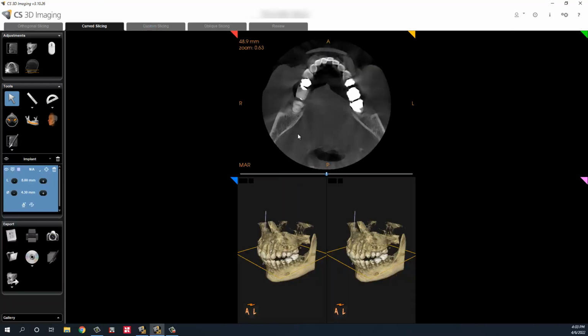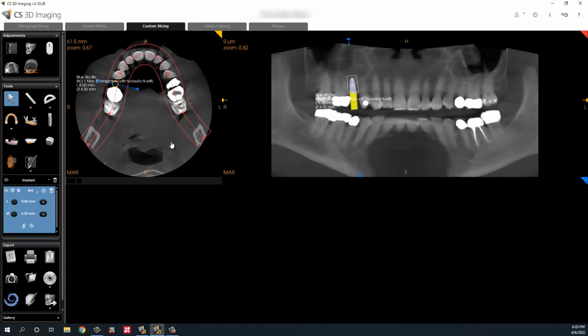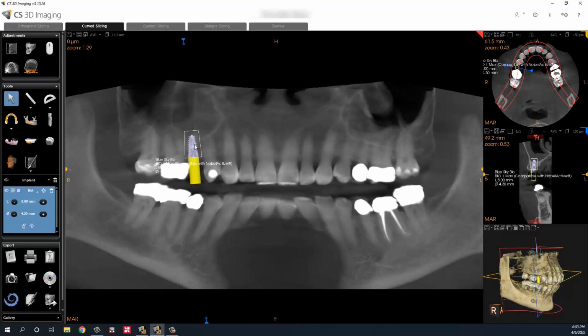Let's go ahead. Let's see about. Nah, I don't want to mess with it. I'm going to skip that. Sorry, guys. I don't want to spend too much time. I want to be just talking about the general workflow.